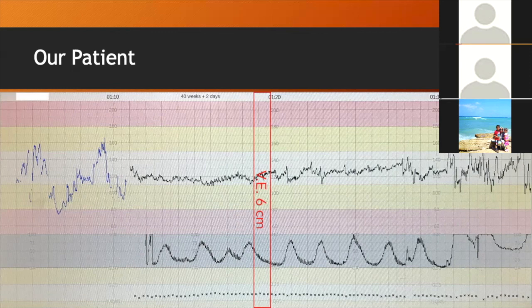What does that mean? Yes, so you have a trace that you can easily describe the rest of the features from. If you have loss of contact so much so that you can't describe anything, well, that's not good quality, is it? Okay, there's no fixed definition for a good or bad quality, but the reality is if you cannot describe the features, that's not good quality.